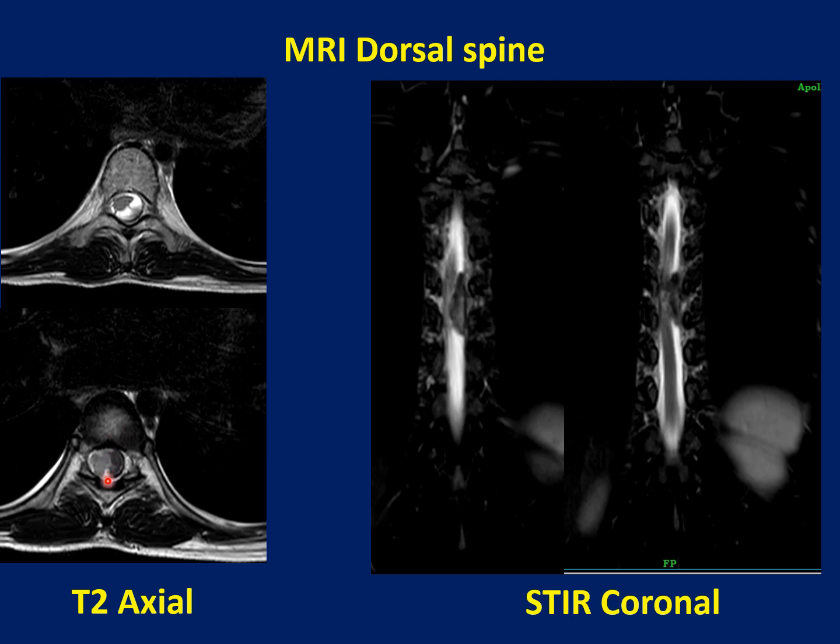And as we keep moving caudally, we are able to see that the mass lesion is causing compression of the thoracic spinal cord and displacing it laterally. STIR coronal images confirm the same finding, that the mass lesion is attached to the dura with a broad base towards the dura, and the medial part of the lesion is causing mass effect, causing compression of the thoracic spinal cord in the mid dorsal vertebral level.